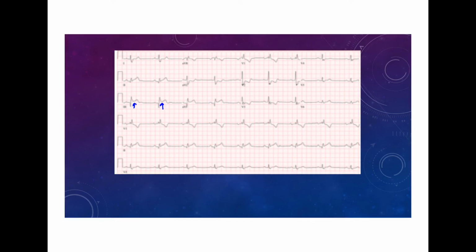So when you put those things together, you say that there's a not exactly acute, but not entirely just old either, since there are ST elevations. So we'll call this a subacute inferior infarct.